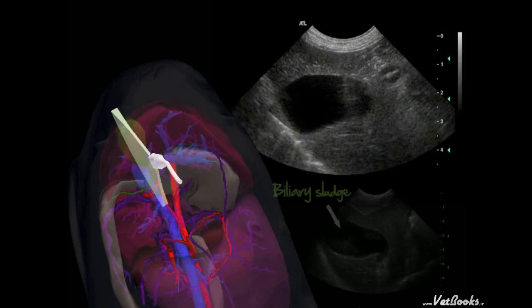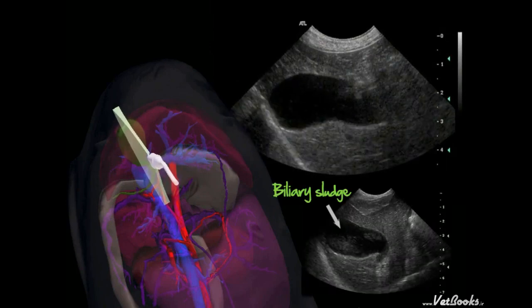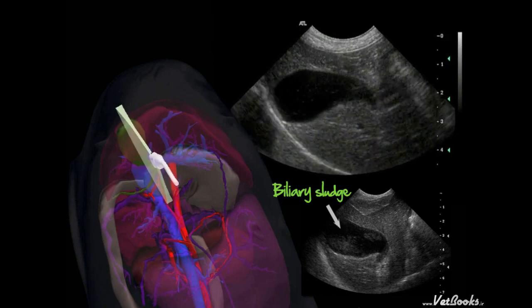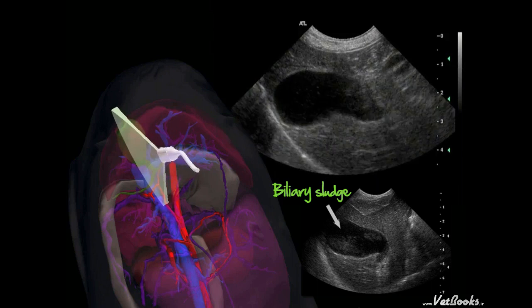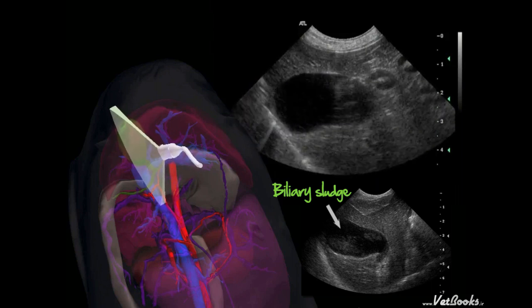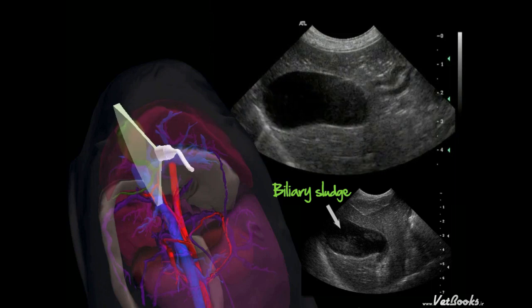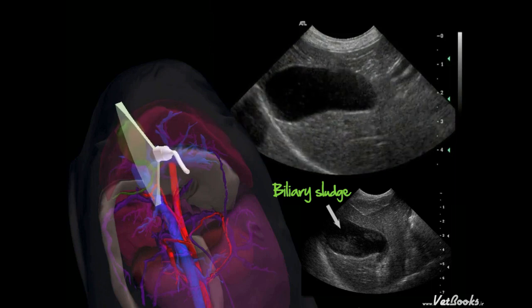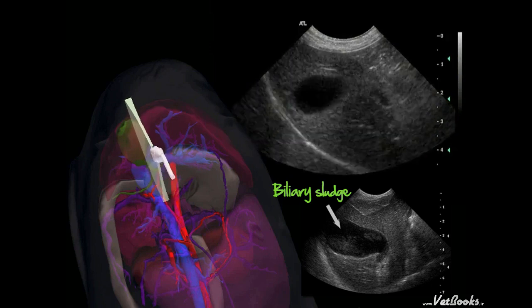Biliary sludge is sometimes identified in the gallbladder of dogs and cats. This modification of the bile content shows up as moderately echogenic, amorphous areas or foci that are normally mobile and sediment over time. Even though this finding has been considered non-significant in dogs, there is growing evidence that this process is probably associated with cholestasis in cats and perhaps also in dogs.